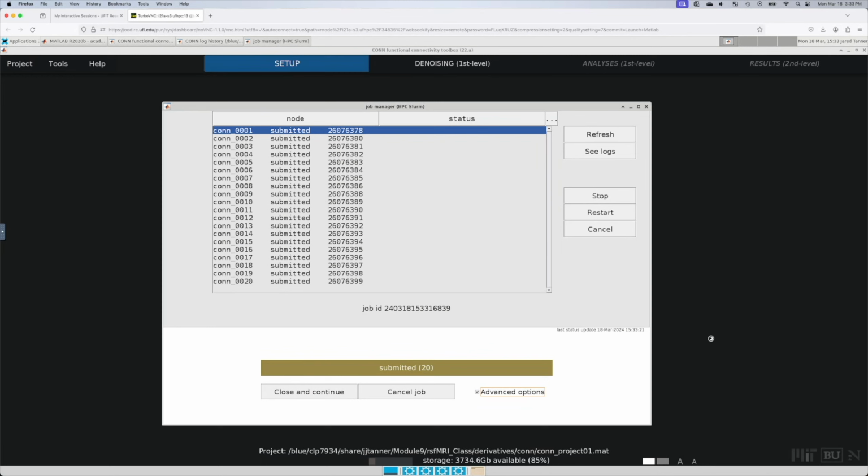Now this first part will take a little bit of time, because it can take time for the jobs to actually start. But we're just going to show you if you needed to reprocess, or let's say you came back and you added data later, which I'm not doing for the homework, so don't worry about it.